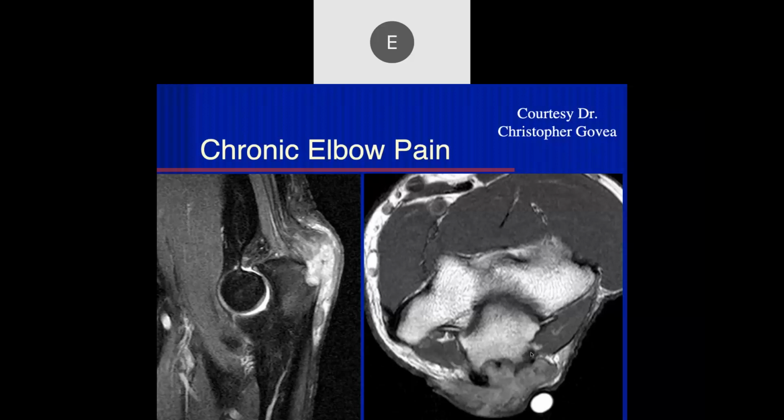I think that's right. But it's the characterization. Insertions. Yes. Right. The insertion. That's a classic location for gout. This soft tissue thickening is very characteristic for gout. It's not really fluid here. We just have this marked synovitis. But the thing that's really characteristic of the gout that I haven't really seen in any other erosive changes is you get these spicules of bone that are very sharp.